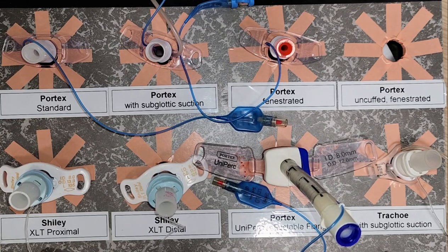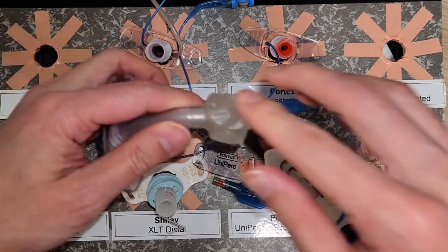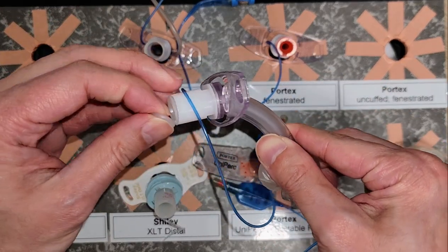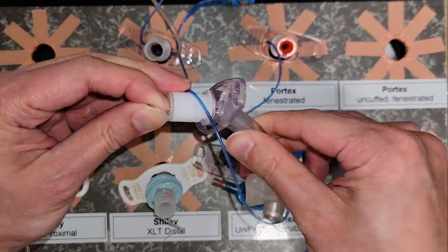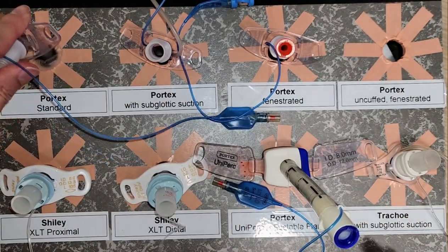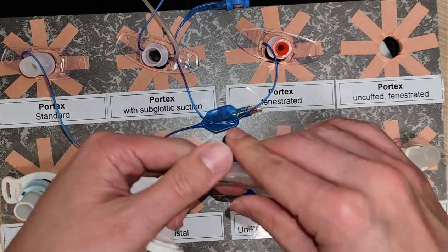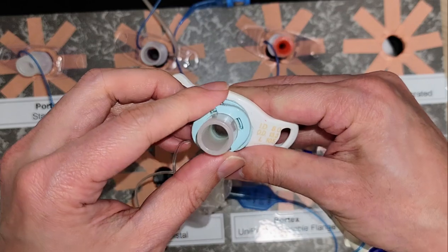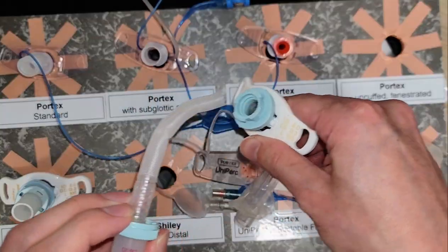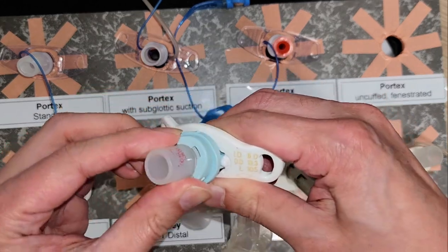And finally, there are different mechanisms in place to fix the inner cannula to the outer. For example, with Portex, as before, you can see the cannulas are simply snapped on to the end. Whereas for Shiley's, there is a rotational locking mechanism to secure the inner cannula to the outer cannula.